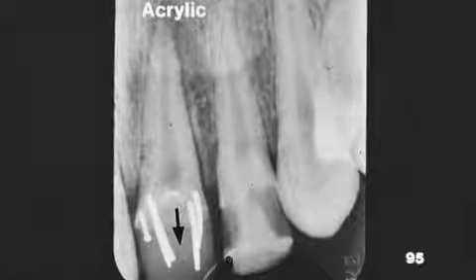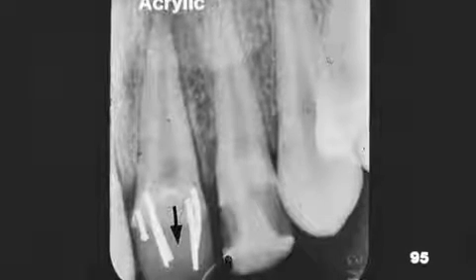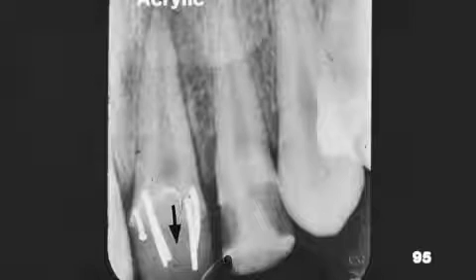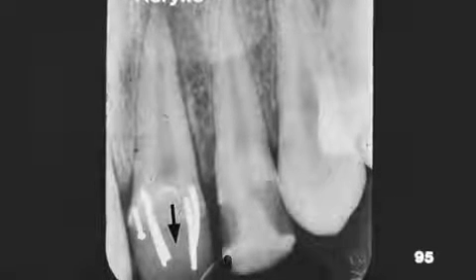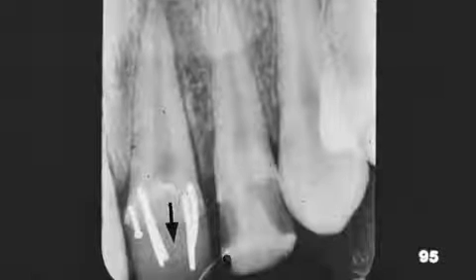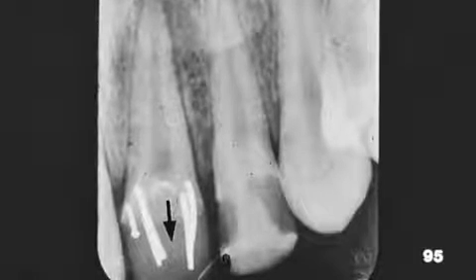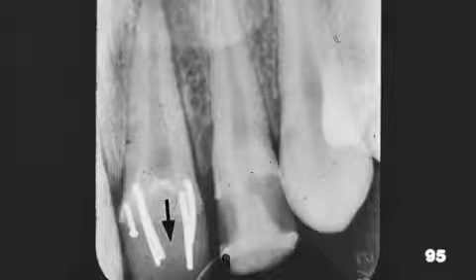The arrow points to acrylic, a radiolucent, tooth-colored filling material. Acrylic is used in making dentures. There were problems with the acrylic staining and with leakage around the margins of the restoration due to changes in temperature. Notice that there's an opacity near the apices of these teeth. This represents the outline of the nose.